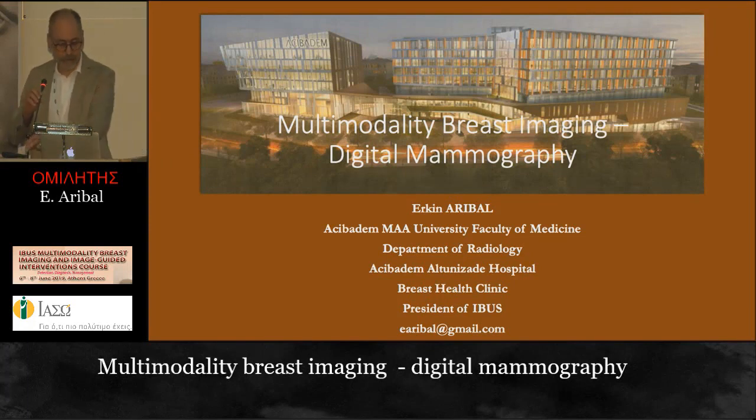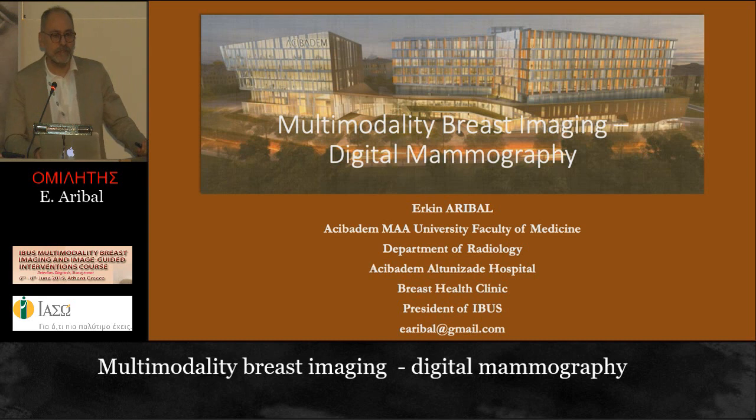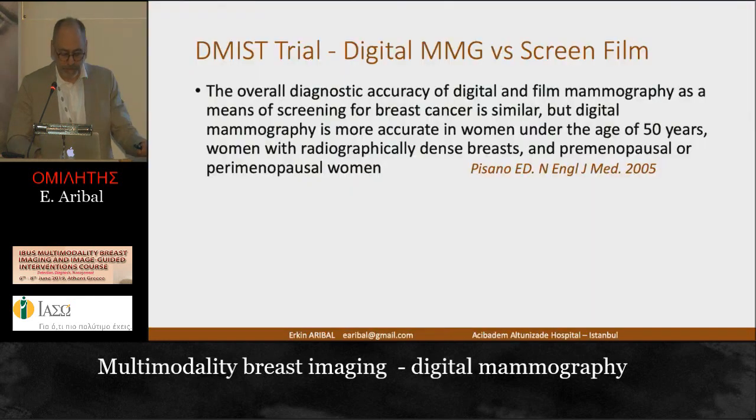So the next talk is multimodality imaging of digital mammography. I have a lot of cases to show you, because I know that you're tired of the whole day. We will see a lot of cases that will also have ultrasound, so we will refresh the ultrasound imaging that Dinah has told you.